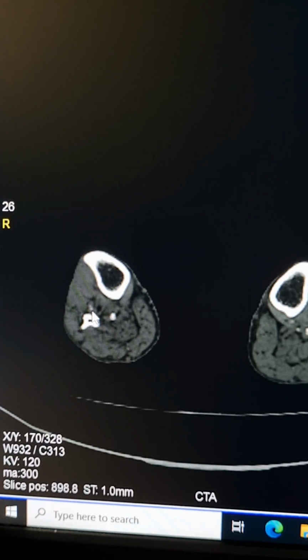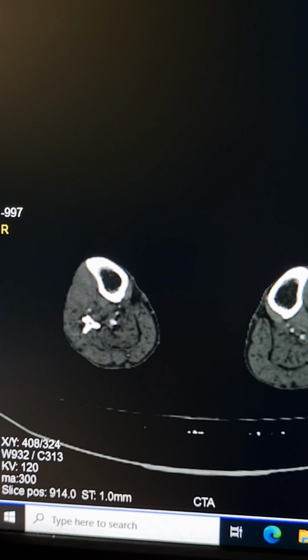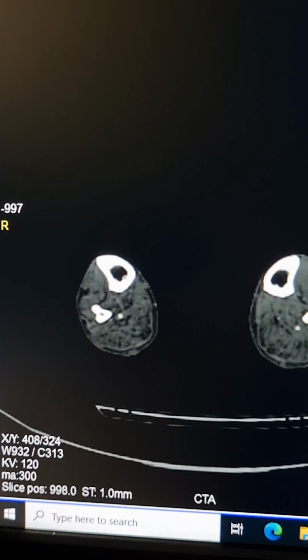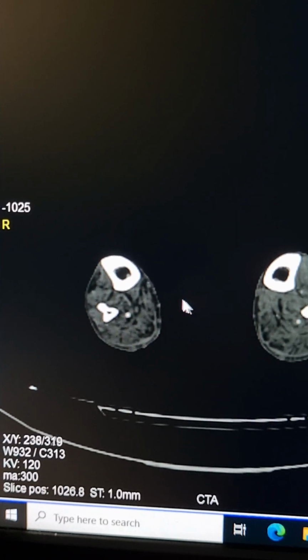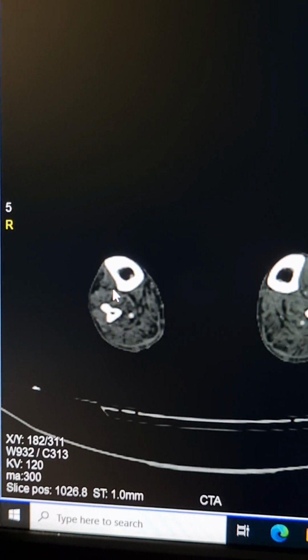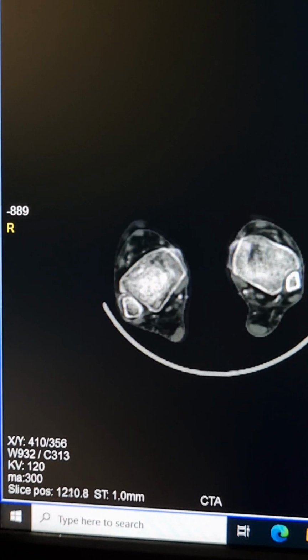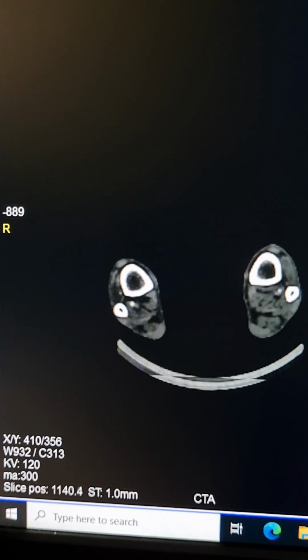Only a few centimeters of the anterior tibial artery are patent, and low down, I'll show you hurriedly, it is thrombosed. It should have been white like this here in this region. Similarly, the dorsalis pedis artery is completely thrombosed. Now I go back.